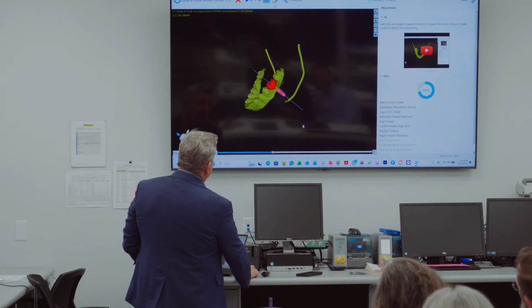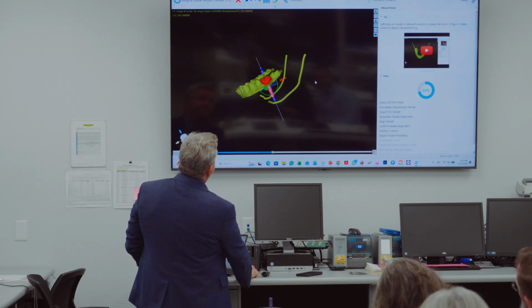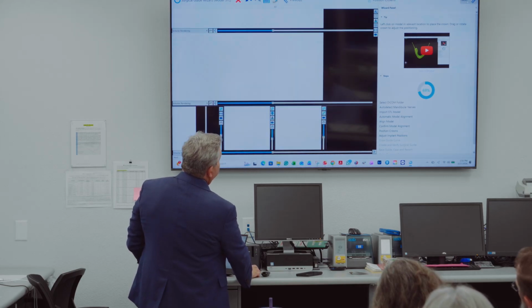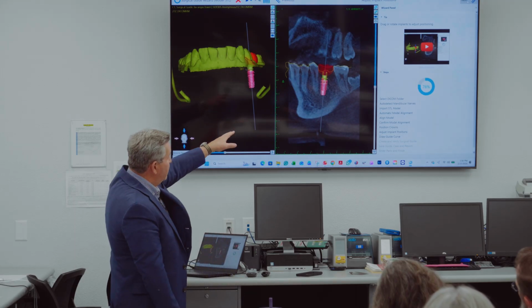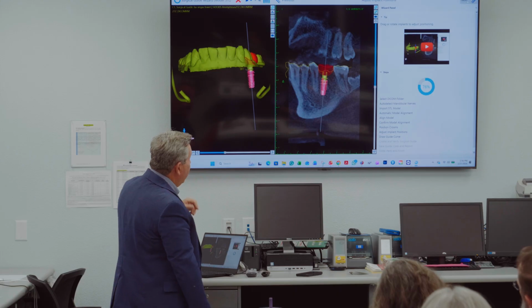So this is your initial preview. So we've got the implant, we've got the die base, we've got the crown proposal, so that's our wax up. All right. Click next one more time and it's going to give you an even cooler screen. Okay, we're back to the X-ray now. So we're actually back to the CBCT where we can see bone and make our judgments.